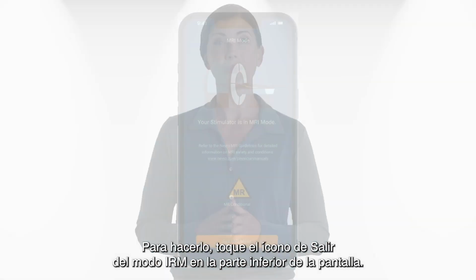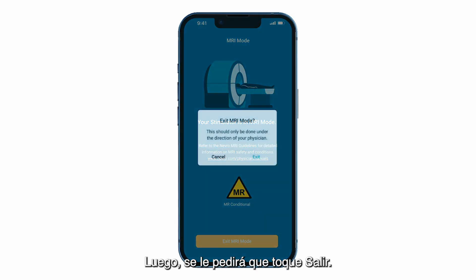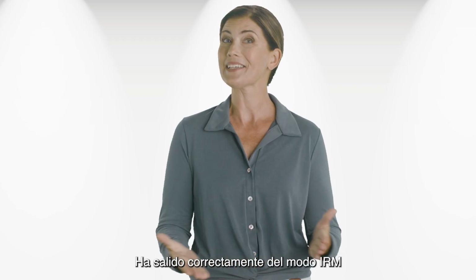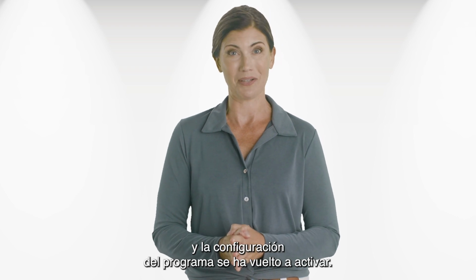To do so, tap the Exit MRI mode icon on the bottom of the screen. You will then be prompted to tap Exit. To turn your device back on, tap the Turn On icon. You have now successfully exited MRI mode and turned your program settings back on.